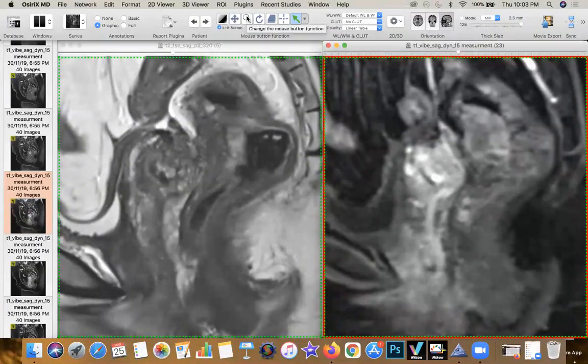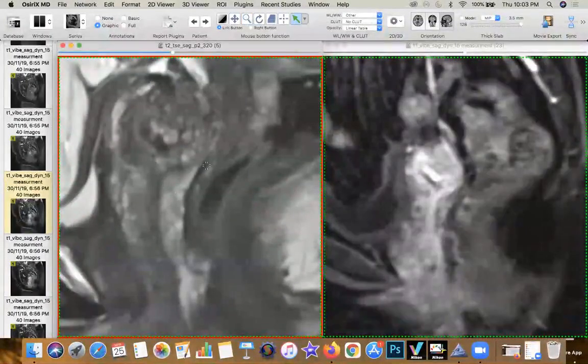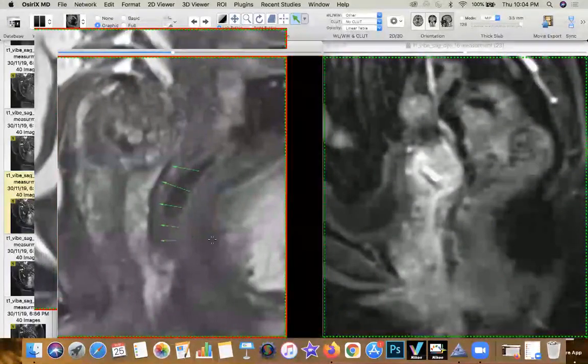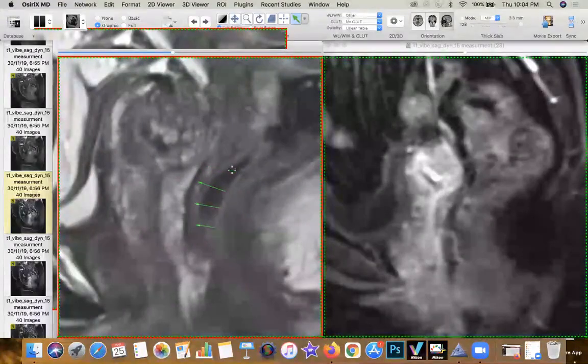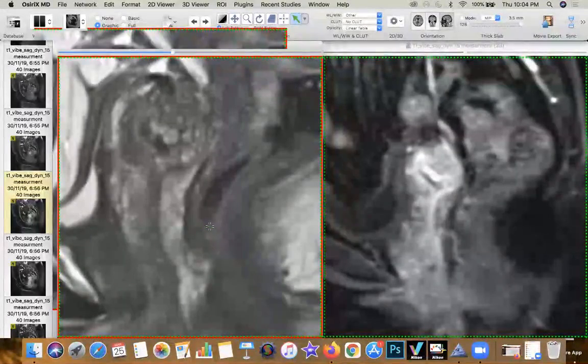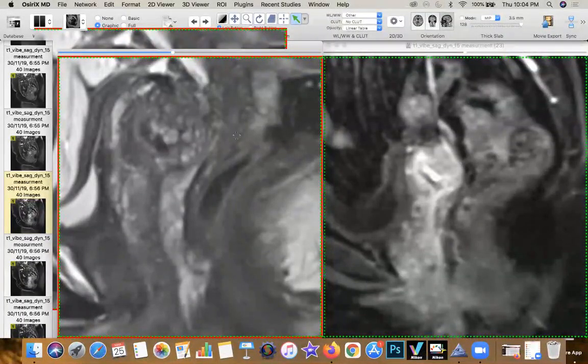Now, another clue for why there could be infiltration which is so low down is the blackening of the anterior wall of the lower rectum going up to the level of the levator shelf. Now, this again is usually a good marker to say that disease was there at some point in time and has now just left a hemorrhagic and fibroinflammatory imprint of itself on the surface of the rectum. Of course, the invasion is a little more rostrally located.